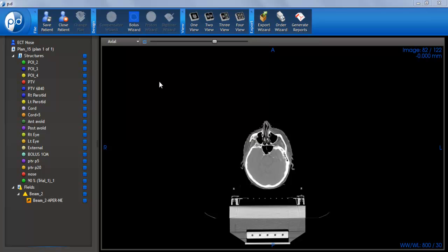If you have any questions regarding loading the patient into the software, please see the video tutorials dedicated specifically to that section. Also, when loading in the patient, I use the .decimal example machine. So if you have not set up that machine yet in your system, please view the video on that to help you set up your machine in P.D as well.